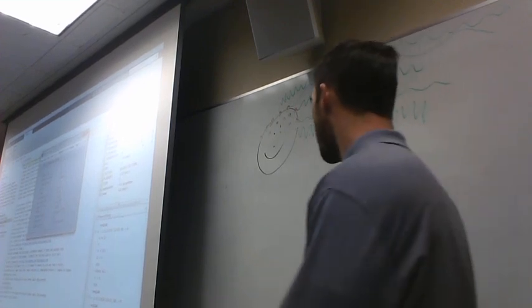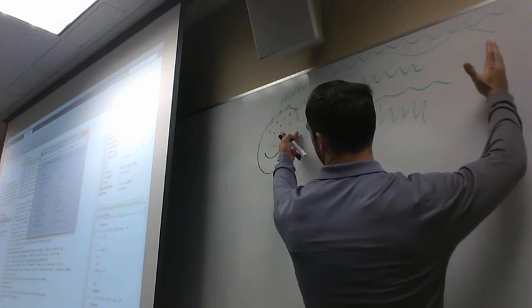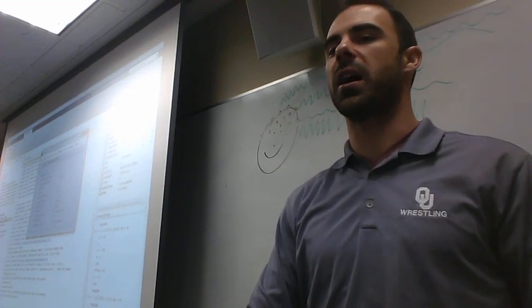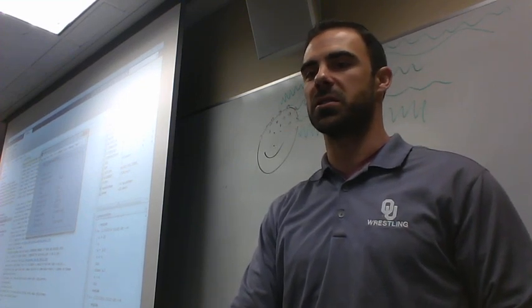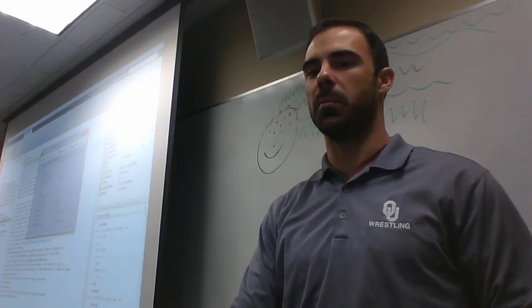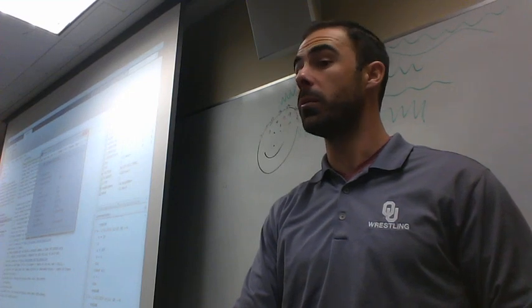So an epoch is a time. Okay, so we have 1 time. It's 1 long time of data. All right, it tells us there's 900 events. We'll talk about that in a minute. Okay, it tells us our sampling rate is 1024 hertz. It tells us our reference sites, the left mastoid and the right mastoid, LM and RM.